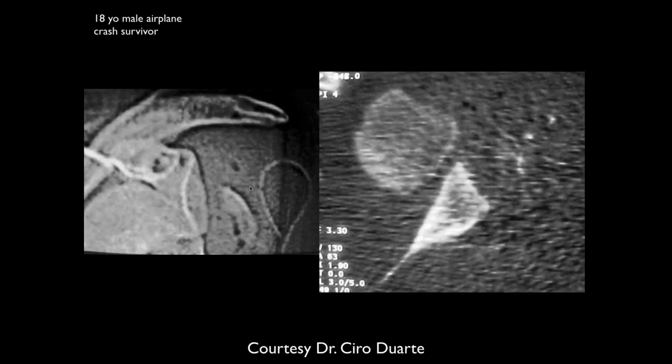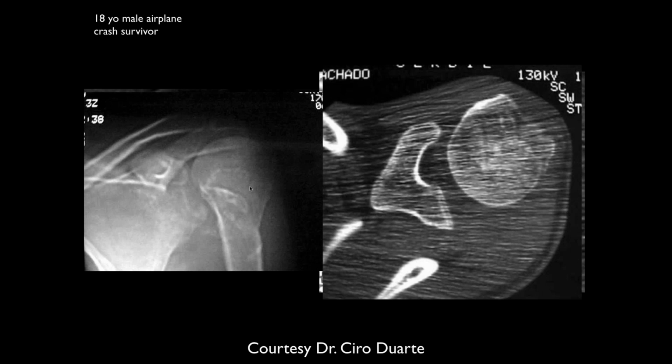And then they tried to relocate the patient, but they had difficulty getting the shoulder back in relocation. Normally you can pop it back in pretty readily. So here the plain film, CT scan, and here we can see some of the bone changes. Here's the big Hill-Sachs injury back there. But notice on the CT scan, there's still a lot of separation here in the glenohumeral joint space.